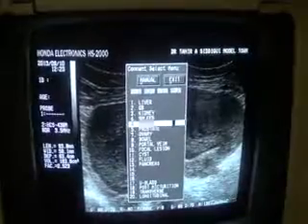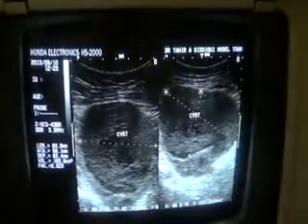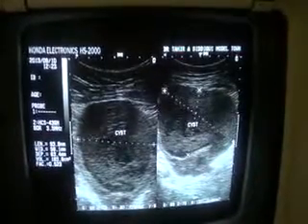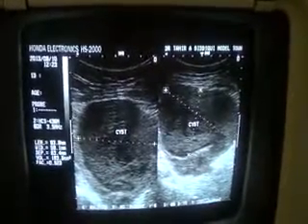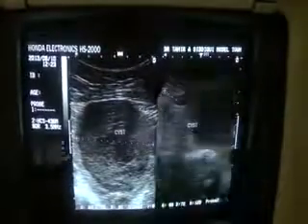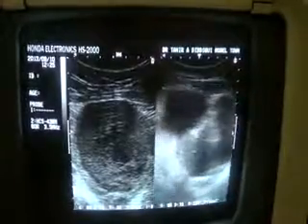This is in fact either a hemorrhagic right ovarian cyst, or number 2, a mucinous cystadenoma, or number 3, the possibility of its being infective in nature cannot be ruled out, but most probably the initial three that I have narrated to you are the differential diagnosis of this case.